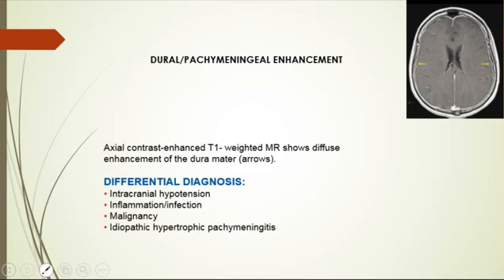When it is diffuse enhancement, the whole dura is enhancing. There is something abnormal when it can be seen in intracranial hypotension, what they call CSF hypovolemia, okay, for whatever reason, which can lead to secondary vasocongestion and interstitial edema in the dura mater. It can be idiopathic, like spontaneous intracranial hypotension, or secondary to lumbar puncture, trauma.